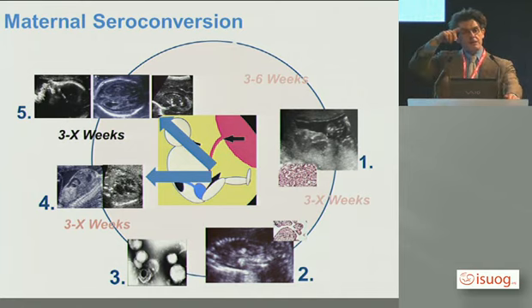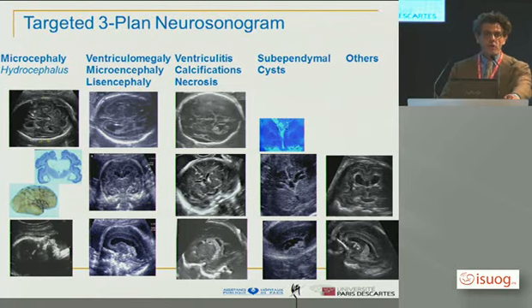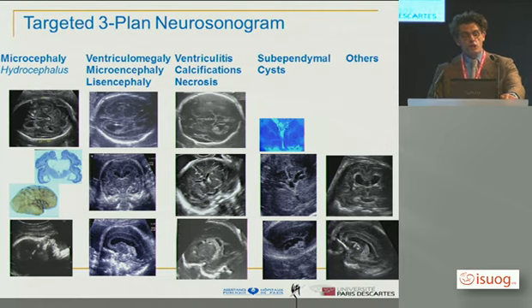At the final path of infection are the lesions of the central nervous system, and specifically of the brain. So that can be weeks or even months after the beginning of infection. And therefore, when you know that the fetus is infected, you should look at the brain not simply in an axial plane, because if you are waiting for microcephaly to develop, the baby will be born before that shows up in 95% of the cases. This is a late event.